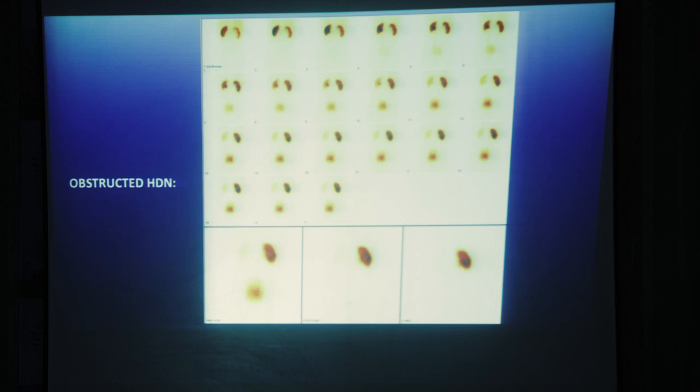So which one is the right and which one is the left? So my DNB is also here. Manali is right. Yeah. So it's the left kidney which is the hydronephrotic kidney, and the right kidney. So your right is the patient's right and your left is the patient's left. So the left kidney is the one which is on.